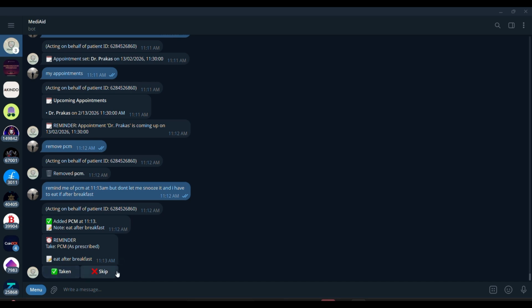And you will be wondering why I didn't get the snooze button, because I said don't let me snooze it. So I didn't get the snooze button. This is for critical dosages which don't allow snoozing.